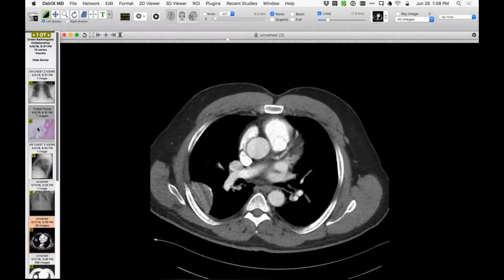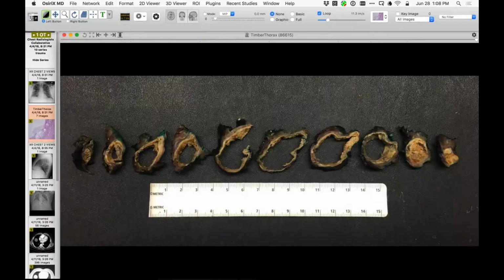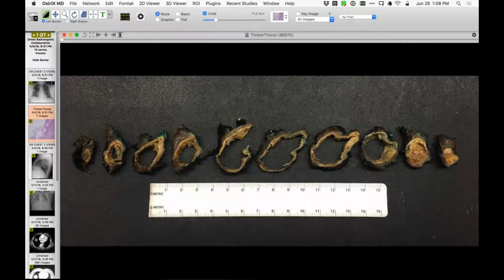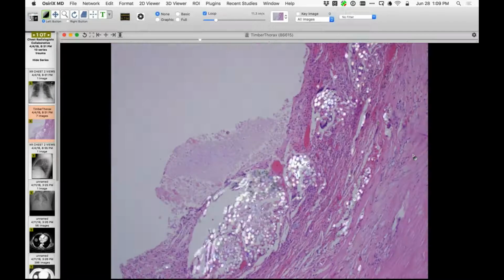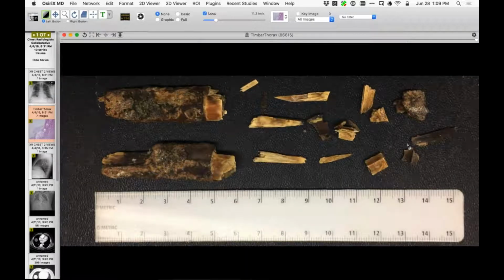So, of course, the pathology is by far the most interesting part of the case. So here are images from what was removed. You can see here that it is a rounded thing, and I'll show you the contents of it in a moment, but the pathologist got quite excited. So here is that round thing, and then you get an idea of the contents looking like that. Let me just go forward to show you that this is the contents.